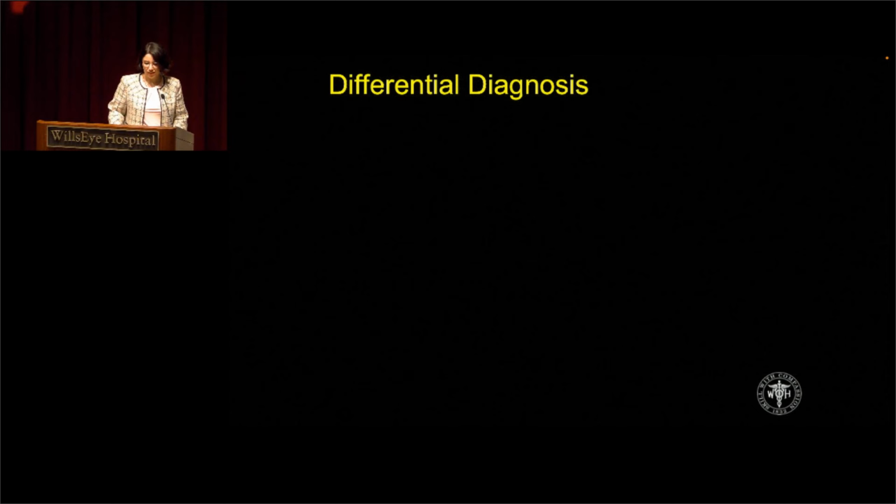Okay, great. So seeing all those images, what are the differential diagnoses at this point?